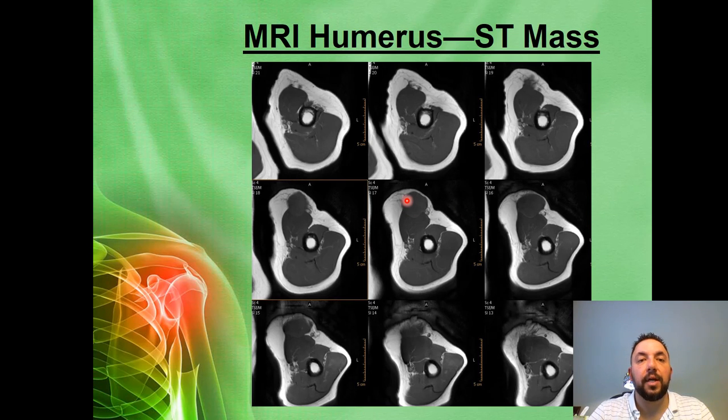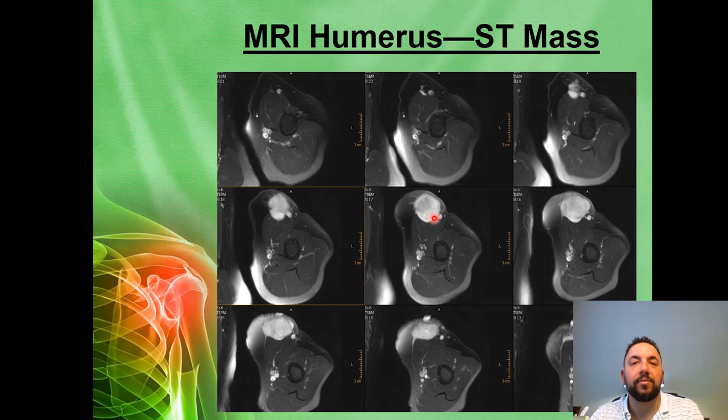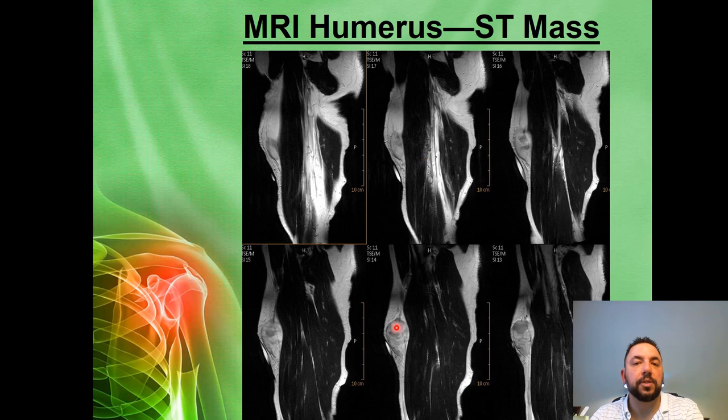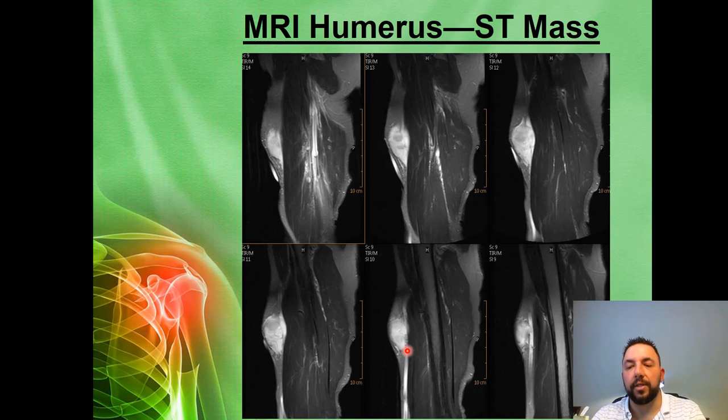So here, believe it or not, this was like an 80-year-old guy who was weightlifting and had that Popeye look to his arm. Felt something pop, felt something abnormal. So it's an axial that we acquire first, but our next best scan plane after these axials are completed is going to be the coronal's nice, but the most optimal is going to be the sagittal because it'll tell the depth of penetration and it'll tell the extent of this particular pathology. So following on an anterior mass, following the axials as far as order of importance, the sagittal tends to be the most important sequence of acquisition.